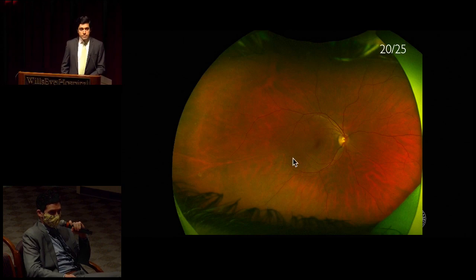The macula itself looks clear. No hemorrhages, no lesions. There is this focal, perhaps hypopigmented chorioretinal scar, area of atrophy out here in the infratemporal periphery, but otherwise the remainder of the fundus looks normal. Excellent.